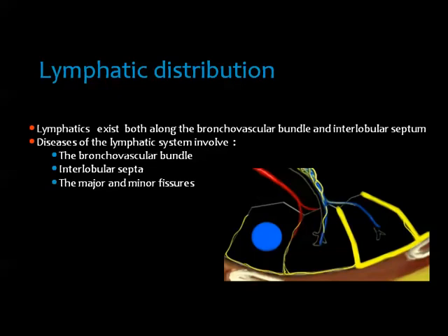Then this distribution is one of the important distributions in diffuse lung disease. And whenever you see it, you can swear that this disease is so and so. I will demonstrate to you. And if you see lymphatic distribution, and we mean by lymphatic distribution thickening of the borders of the lobule, as well as its attachment or its relation to the pleural surface.